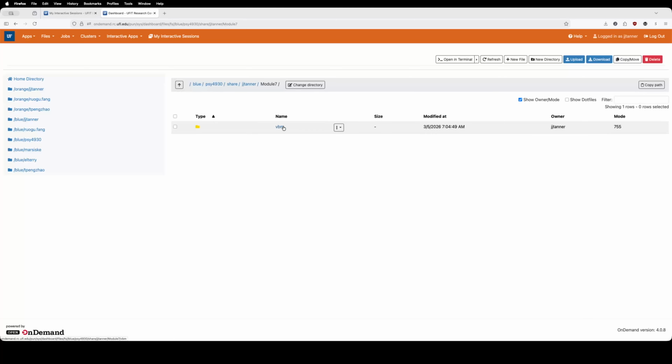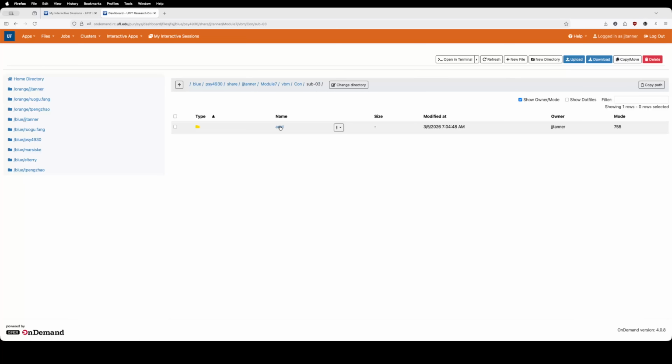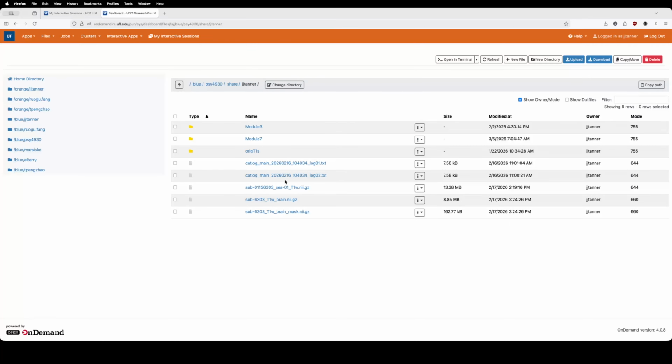So we can click in and see we have a group of brains from control participants and a group of brains from people who have schizophrenia. And we can click in and see there are the NIfTI files within each of the folders. Okay, so I have a copy of the data. I will show you one more way to copy it, once we get MATLAB open.